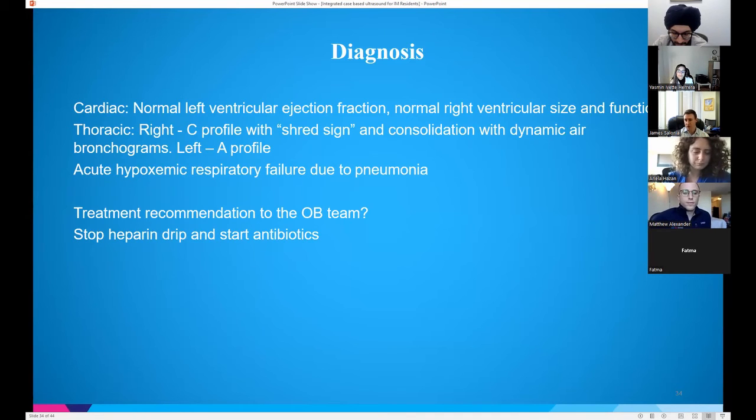So these are real cases. Some of these are real cases, and we've had this before where people think it's a PE, and there's other things going on, because everyone just remembers some of those incidences where obviously we've had some young patients with PE, sticks in your head. But definitely the ultrasound proved that wrong. You didn't see any RVOT dilation. You didn't see any paradoxical septal wall motion. So certainly the shock or the hypotension, everything was due to something else.